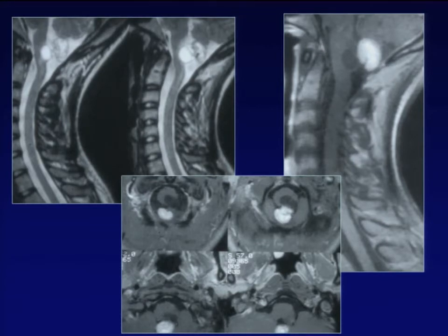And sometimes hemangioblastomas, when they cross the craniocervical junction, may produce non-specific neck pain. Remember this. We're dealing every day with many, many cervical MRIs, dealing with degeneration, of course. This is the main issue. But remember to look upwards to the foramen magnum. Sometimes you can come up with a diagnosis like this, hemangioblastoma crossing down.